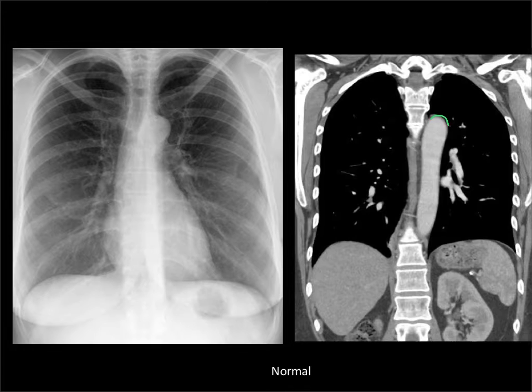So here's our aorta coming down, and we can see a nice soft tissue air interface that's going to make that line. We don't see the other side, the more medial side of the aorta, because you can see here it's up against the fat of the mediastinum, and this is the azygos vein right here. So there's no air against it to allow us to see that line.